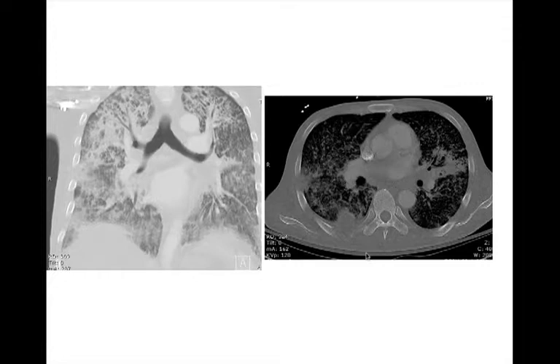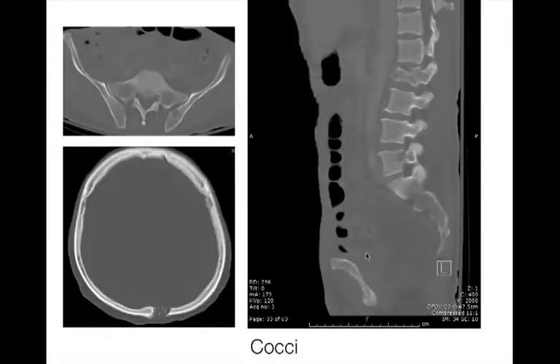This patient was very sick and they were septic and they cultured these things and these were cocci. So this was diffuse osteomyelitis, diffuse systemic coccidioidomycosis infection causing osteomyelitis and mimicking metastasis.